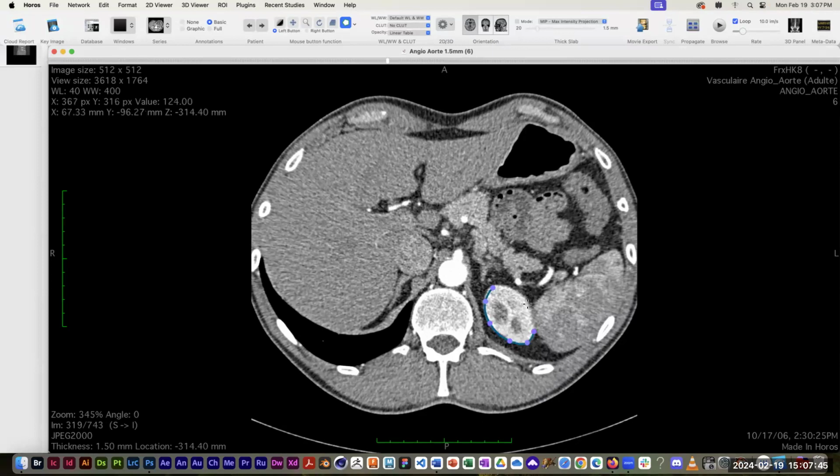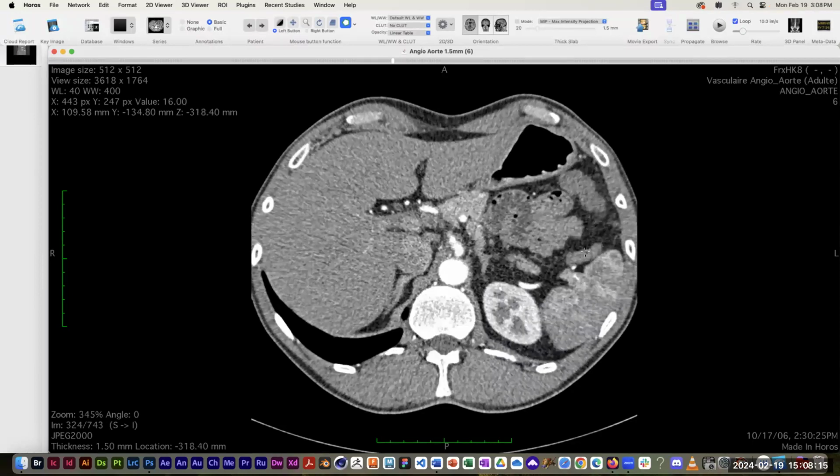Why do you do this one, 5 or 6? That's whatever, if you're still doing the same process, like simple. There's a command I'm going to show you in a minute to generate the missing ROIs. And it seems to only be able to do that with polygons. Oh. It doesn't seem to be able to do it just painting with pixels. Yep.